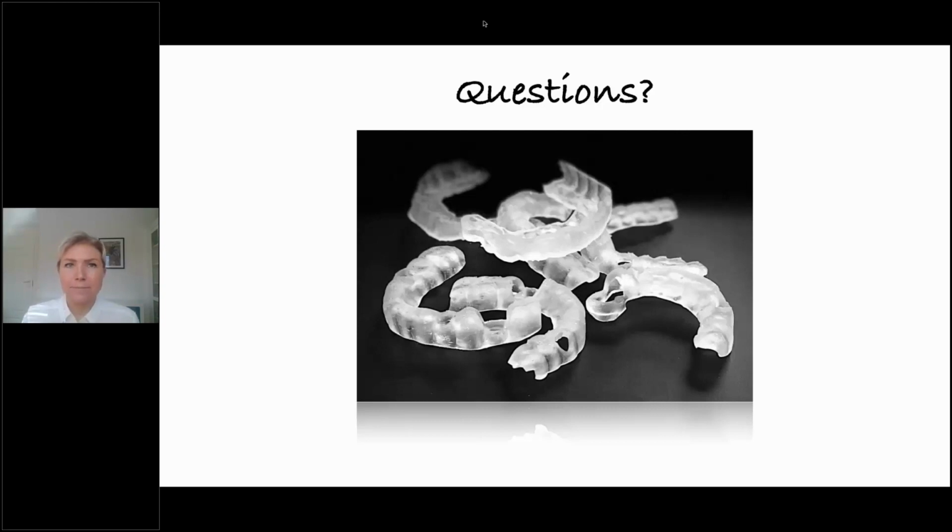Why? Because what I find is, even though we have scatter, and if you remember that first case I showed, a lot of times you can get pinpoint cuspal data without scatter. So I would say always have your patient in the open bite position, whether it's the bite tab on the CT scanner or a cotton roll. It'll separate the cusps of the teeth, and it will give you enough information that you can successfully merge these.